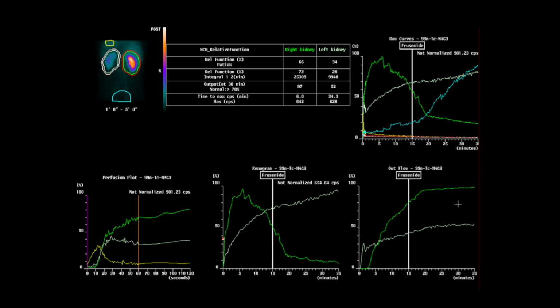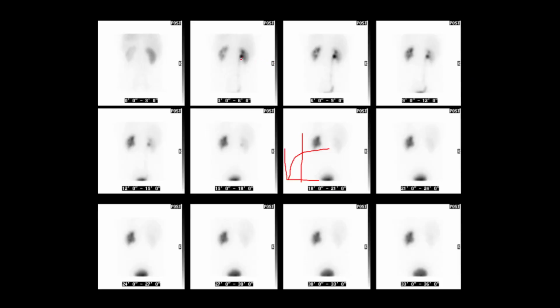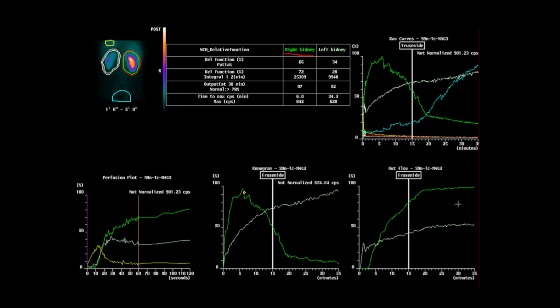So unfortunately, in this particular case, the two shades of green denote the kidneys. The bright green in this case is the right kidney, which is the normal kidney, and we've got tracer uptake. Bit of hesitancy here, maybe. Perhaps that's because of that prominent renal pelvis which we had there, but that's just pretty much a normal extrarenal pelvis, and you might see that. And then you can see it's begun to clear normally, quite a bit of normal clearance, and that continues after the diuretic to good final clearance at the end.